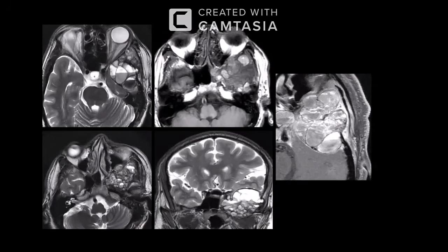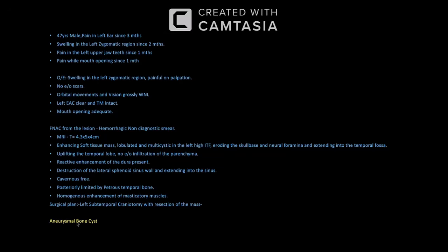What do you think? My differentials include aneurysmal bone cyst, and this is my top differential. Telangiectatic osteosarcoma is less likely as there is no large soft tissue component. Okay.